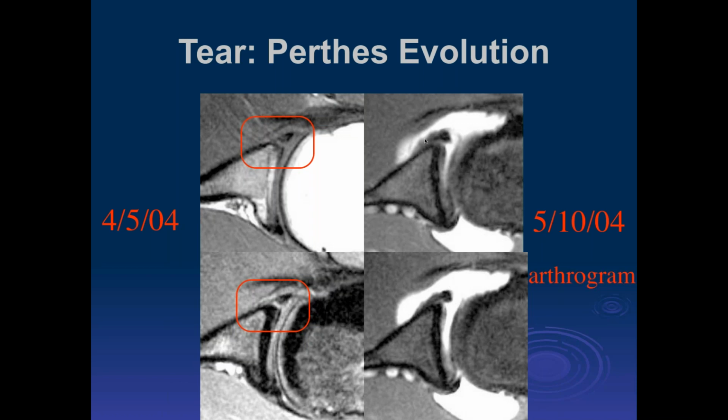Yeah, look how thickened it's become. That's what it was at the time of the acute injury, and just a month later, see how thickened it is. We've seen examples where ligaments thicken after injuries, or at least we call them that. And here's just an example of what it looks like. Due to the injury, this is healing, the body trying to attempt to heal the injury to the capsular insertion, and it's much more thickened.